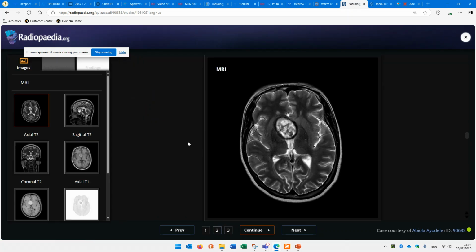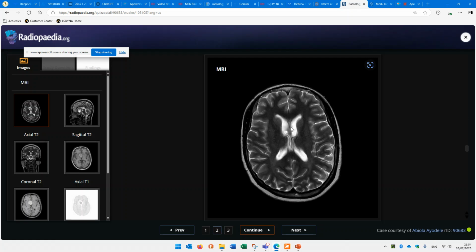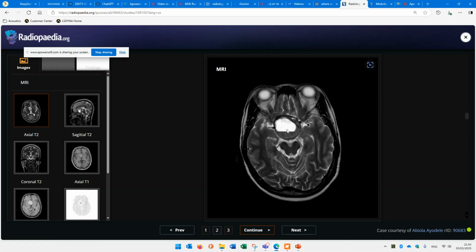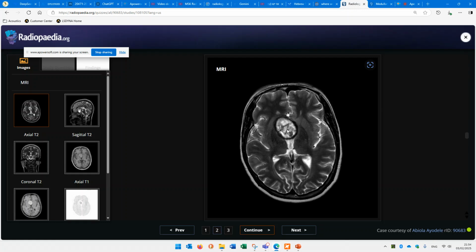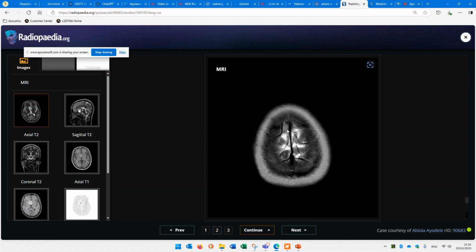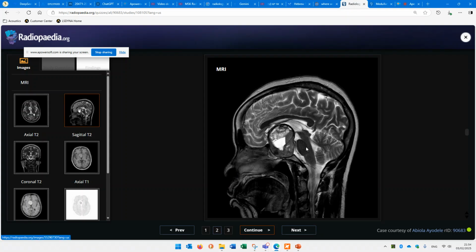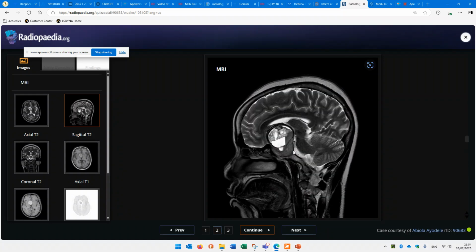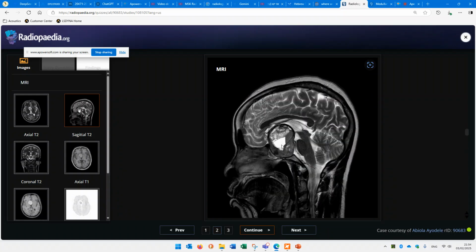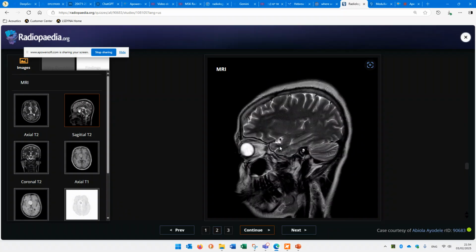Okay, let's see. Okay, this is causing the bilateral visual loss. It's really in the area of the sella turcica. It's probably from the pituitary, but now we need to understand what the hell it is. Okay, you don't really need to look too much for it. Doesn't really look like a macroadenoma. It looks like, I don't know, different types of tissues inside it. Teratoma or something.